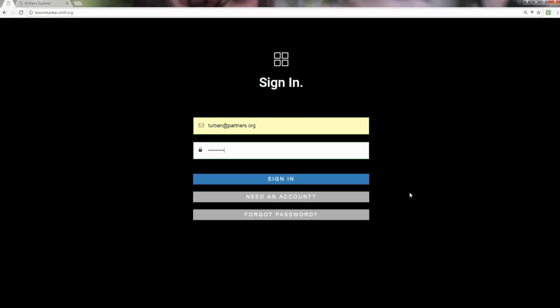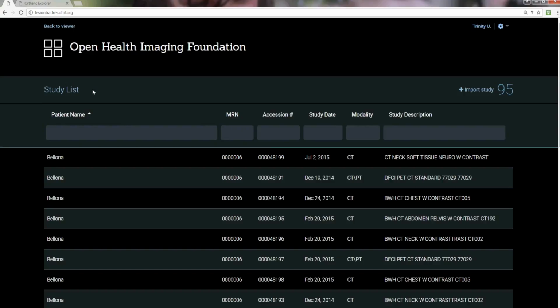Welcome to LesionTracker. If you are a new user, please click Need an Account. For registered users, enter your email and password and press Enter on the keyboard or click Sign In. After login, you will be directed to the study list page.